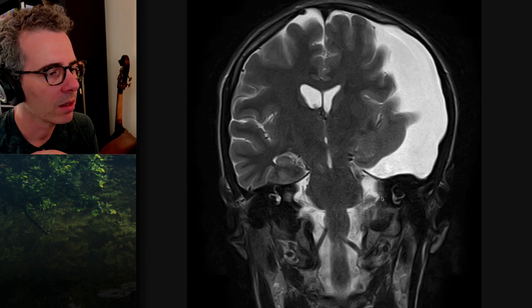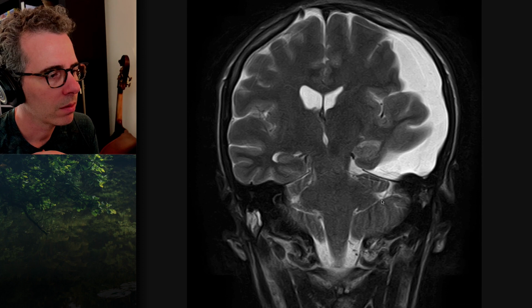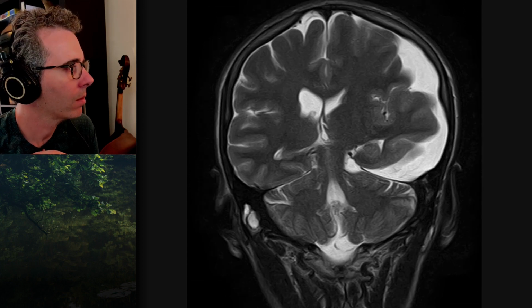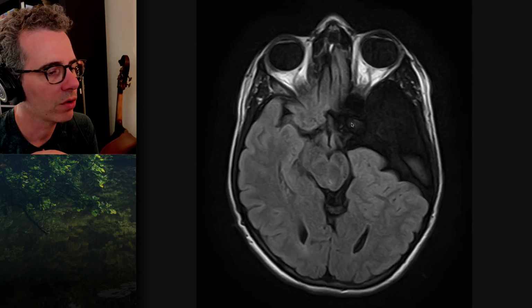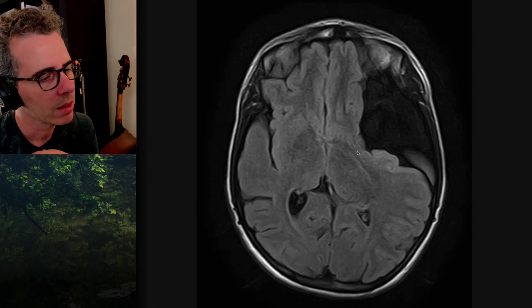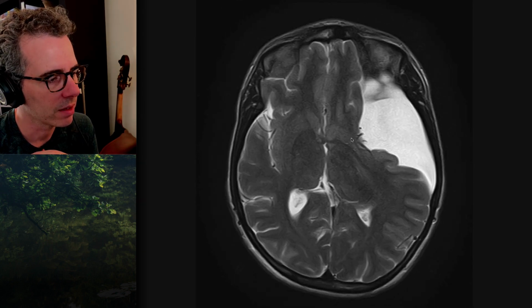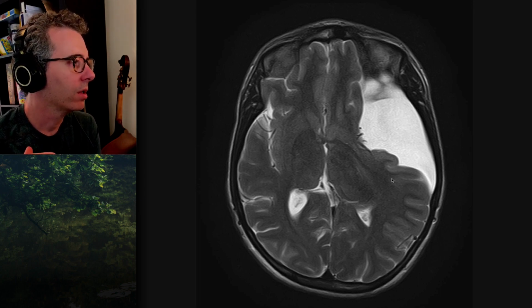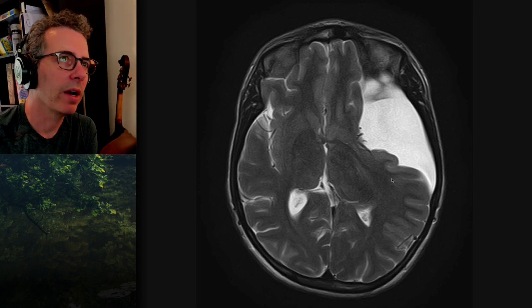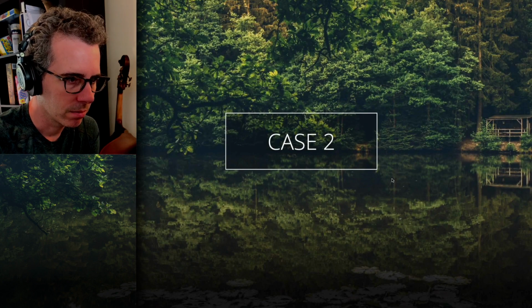callosal abnormality. So if this isn't fat, what else could it be? It might just be slow flow or flow-induced signal in a vein or something on T1. Okay. I'm trying to see if there's chemical shift artifact around there to account for it, but I'm not sure. If we had a CT, we could sort it out easily, or some other, maybe gradient echo might show some blooming or some fat suppression in that area. Yeah. Alrighty.